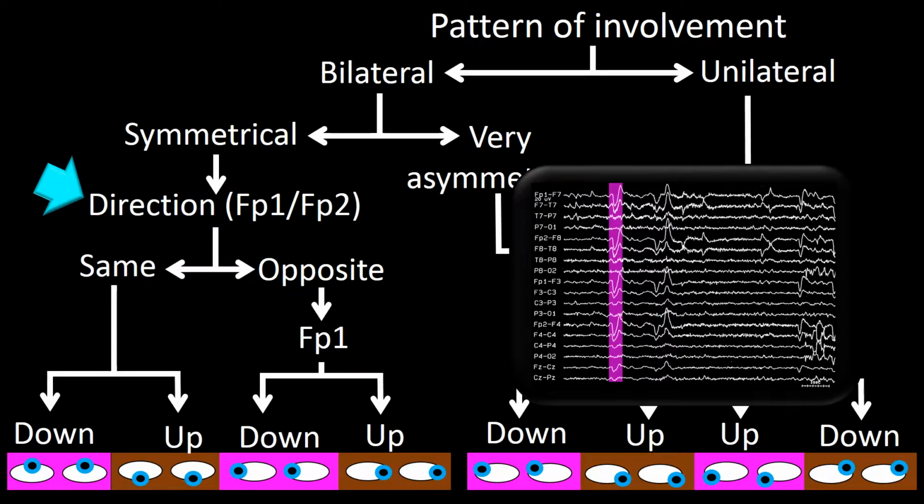The direction of the eye movement in both eyes was the same, and that direction was down. So the eye movements were going up.